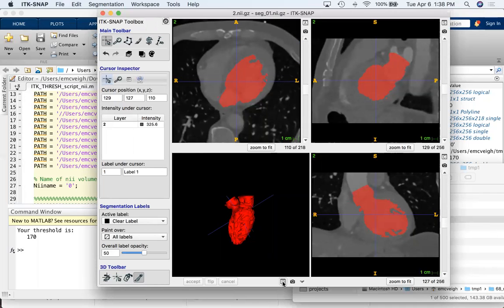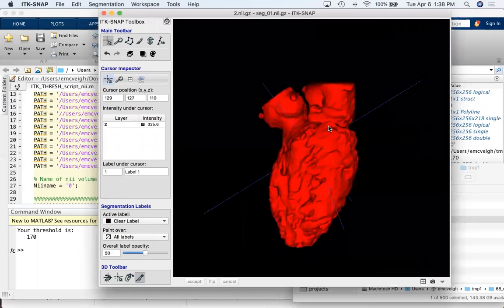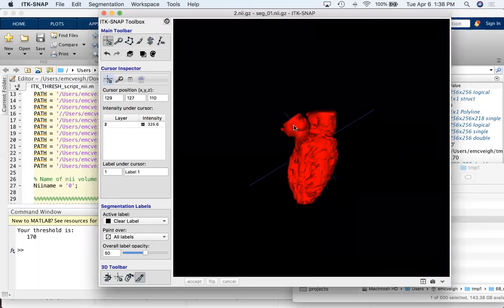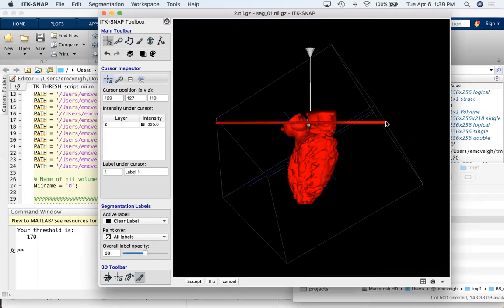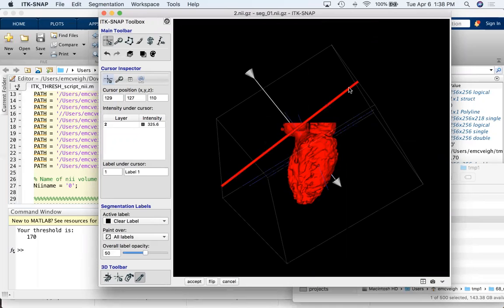I think you can hit 3D such that only 3D is on your screen. And I'll zoom it up a bit. Actually, no, because remember, we couldn't see the arrow. So let's go click, click, up. Have to flip, so the arrow's on this side. Okay, good. Accept, and I cut the top off.